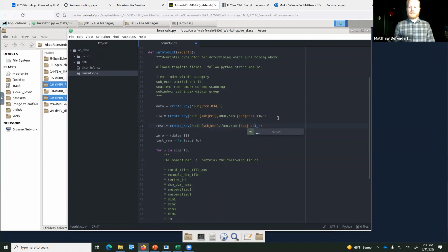The resting state scans, is there a way to exclude folders when scans had to be repeated due to motion, which would give 2 or more T1 folders? Yes. Okay, so there are ways to do it, and we can take a look at that in the DICOM info. In the TSV file, I think there might be a way to tell if, actually, I'm not totally sure.